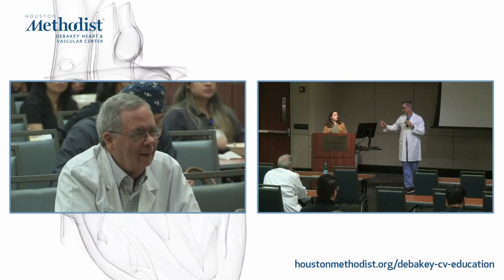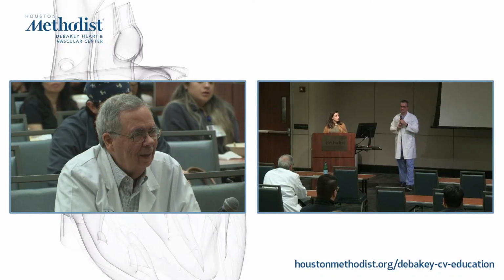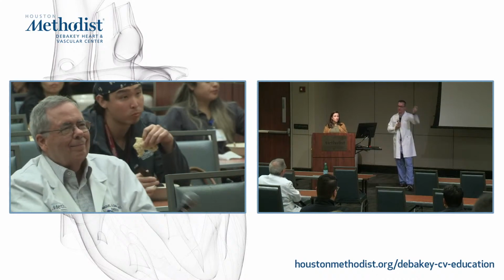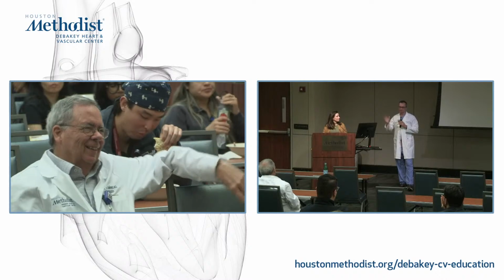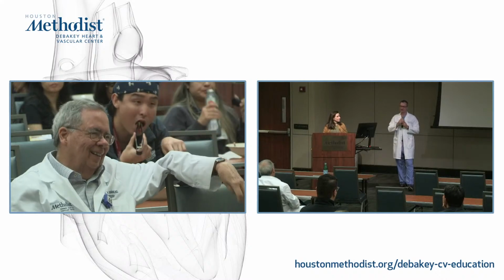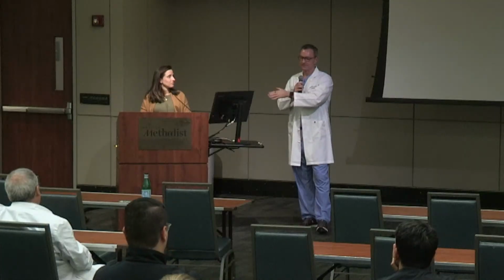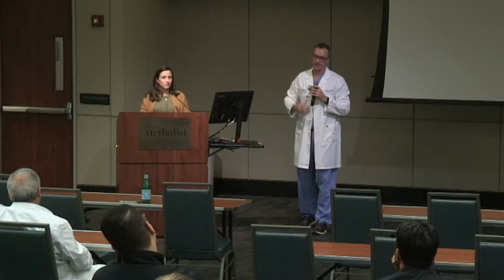And the other big thing that's happened is we've learned how to do the imaging. When we first started, we didn't know about the short axis view and the inflow view, and we were just putting the probe everywhere trying to see anything. So the whole field has decided, here are some fundamental views. Let's learn the fundamental views, and then things get a lot easier. So it's a cookbook now.